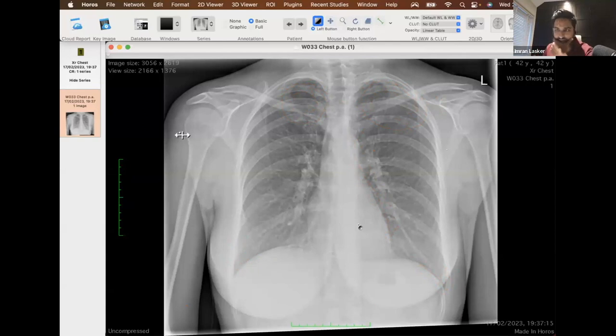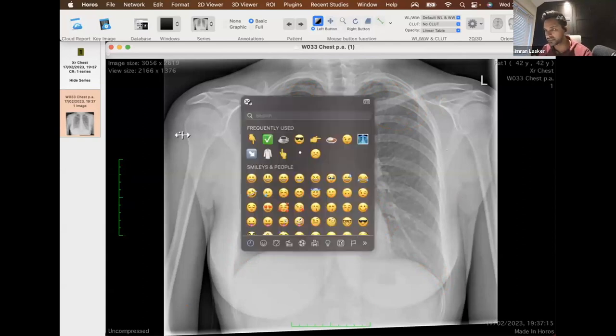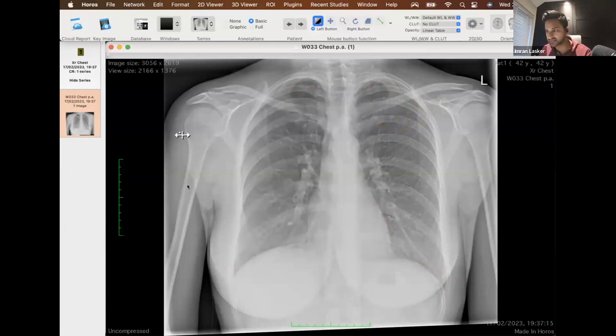So someone said bilateral axillary masses. That's a very interesting thing to think about. Sorry, that's not me giving a laughing emoji. I am taking it seriously. So you're thinking around these areas, right? It's not a bad shout. I would say maybe possibly, but you have to also understand that people can have skin folds. So you can have skin folds, it can be all sorts of things. So I wouldn't necessarily jump towards that, especially in the context of maybe something else going on.